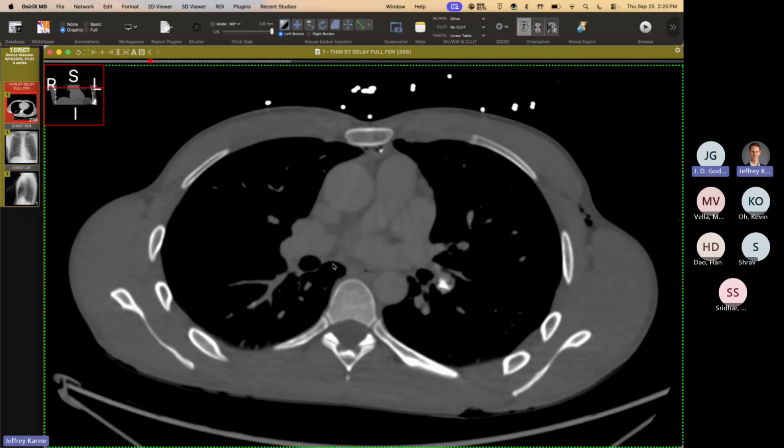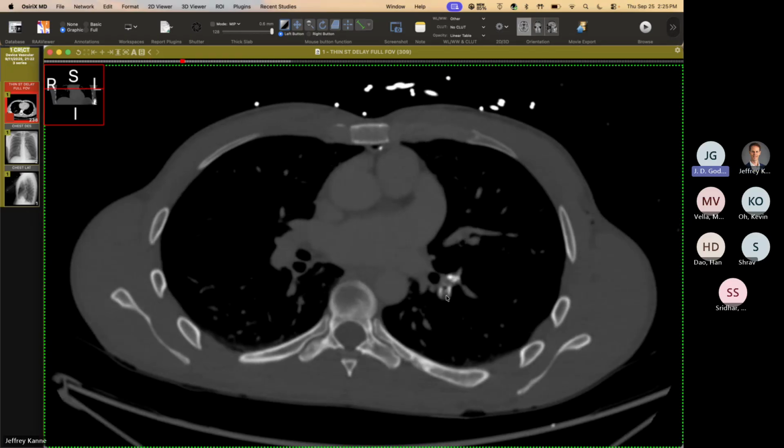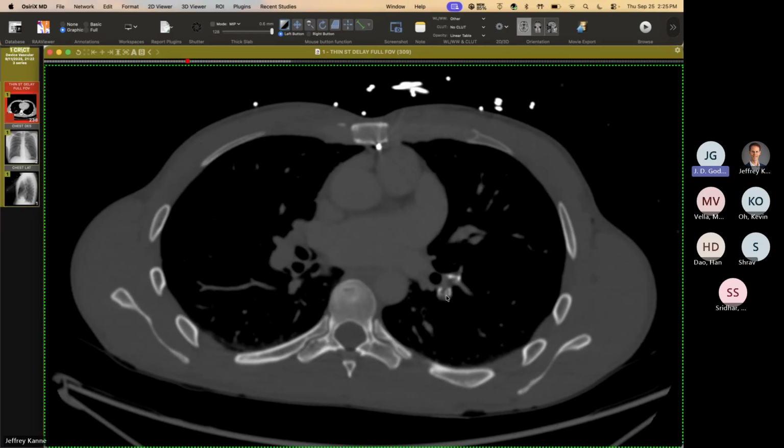Yeah, you can actually see that it's a cuff. Yeah. So right here. This is a cuff. It's a fibrin sheath, calcified fibrin sheath cuff. But these are quite large, and they actually embolized. I've seen them fixed in the veins before, like the SVC and the brachiocephalic veins from an old dialysis catheter. And I mean, they're stuck in there, but I've never seen one actually embolize.